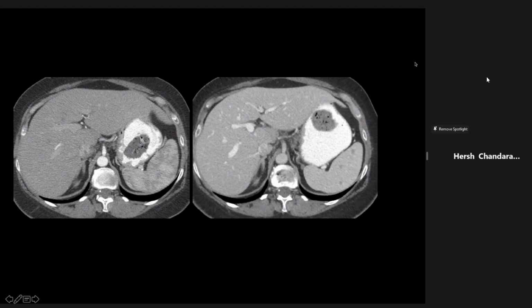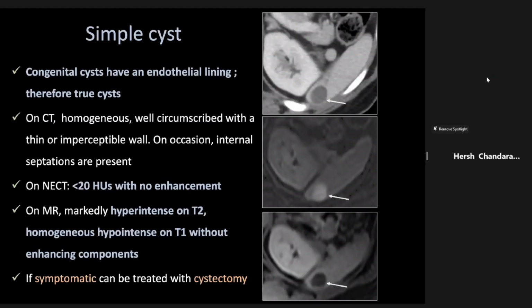We see multiple small lesions in the spleen. You see them only in the venous phase, when the spleen is homogeneous. In this heterogeneous spleen on the same scan and at the same level, you don't see what you see here, which are these diffuse small lesions in this patient. So the first lesson is that you need to choose the venous phase to evaluate and avoid the early arterial phase, which has this arciform heterogeneous enhancement, which may obscure lesions.